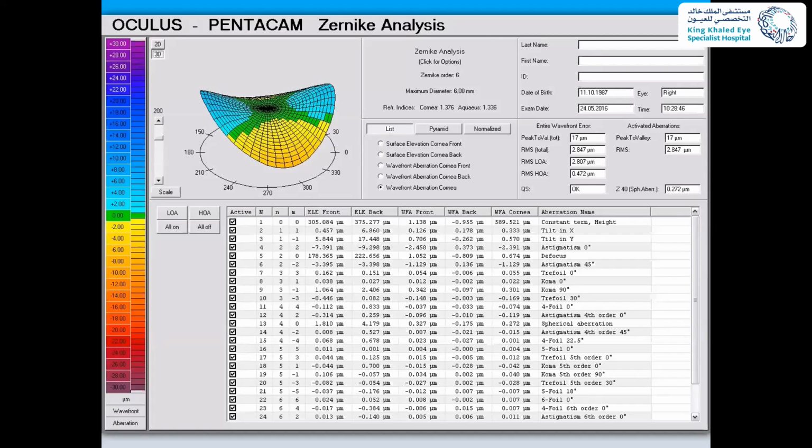So in a virgin eye, you can use SIM-K, okay? And this SIM-K is more or less the same as IOL Master K, okay? So you cannot use sagittal or axial K, you have to use SIM-K. If the patient has got a corneal scar, or a previous LASIK or keratoconus or RK, and sometimes the cornea is so irregular, you cannot use the IOL Master K at all. In that case, you have to use equivalent K, and you can put it in IOL Master. You got my point? Yes, clear. Thank you.